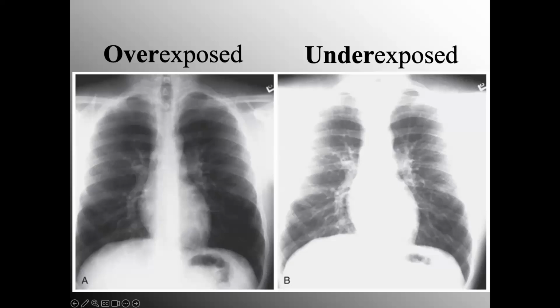If the image was obtained using either digital or computed radiography, which is mostly the case, we know the image can be windowed lower on the computer, resulting in a more interpretable image. Underexposure causes the image to be quite white. There is a major problem for adequate interpretation here. It will make the small pulmonary vessels appear prominent and may lead to thinking that there are generalized infiltrates when none are really present.